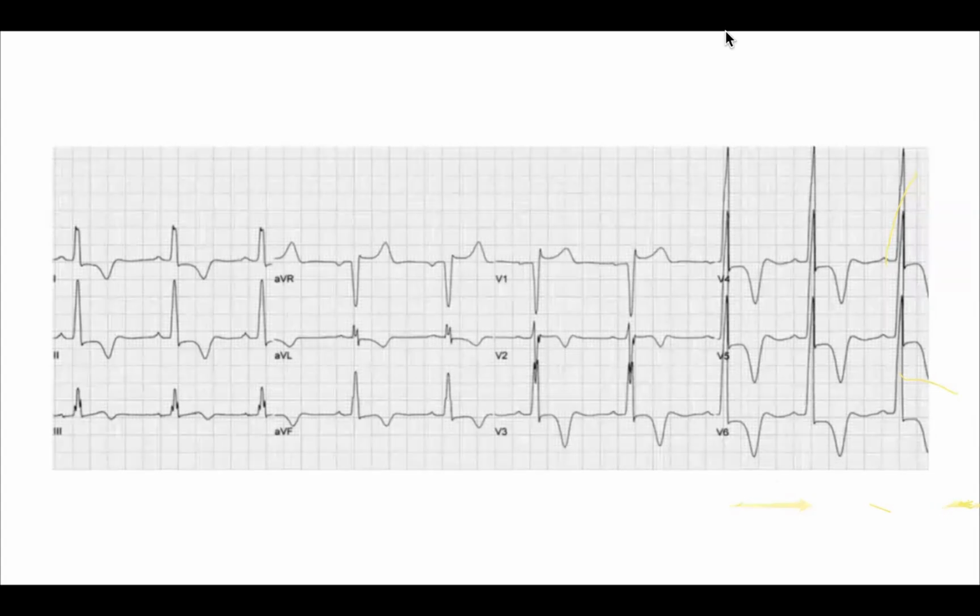Fulfilling the LVH criteria. But remember, the same ECG can come with a person who's having LVH with strain. But in that ECG, you won't have these symmetrical dagger-like T inversions. These T's are symmetrical. In strain, there are ST depressions, downsloping, and the T's are not symmetrical if you divide it into two, right? So what is the diagnosis here? Left main coronary artery occlusion. No. I told you the complaint is recurrent syncopal episodes in a young male.